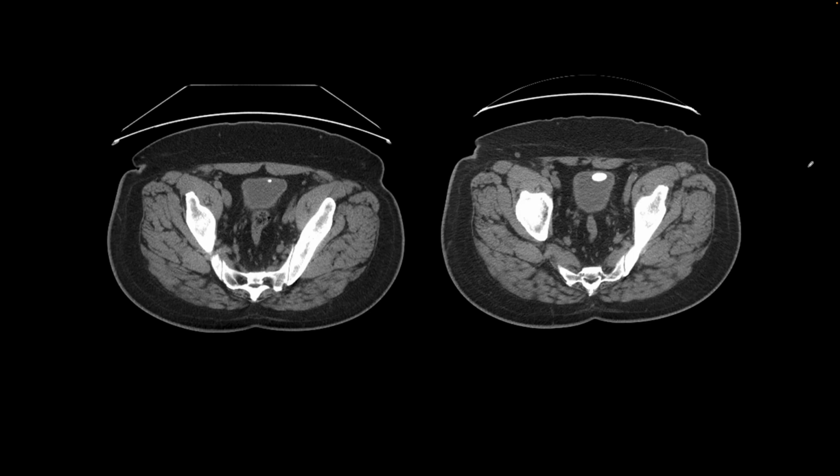Here's our next patient, and these images are from their CT scan of the abdomen and pelvis at two different time points, and these were acquired prone to evaluate a urinary bladder stone. Prone imaging is very helpful when on supine imaging we are unable to differentiate between a stone that is stuck at the UVJ or a stone that is actually inside the lumen. When you do prone imaging, the stone becomes dependent and it's seen like this. And on serial imaging, we have followed that the stone has become larger over a period of time.